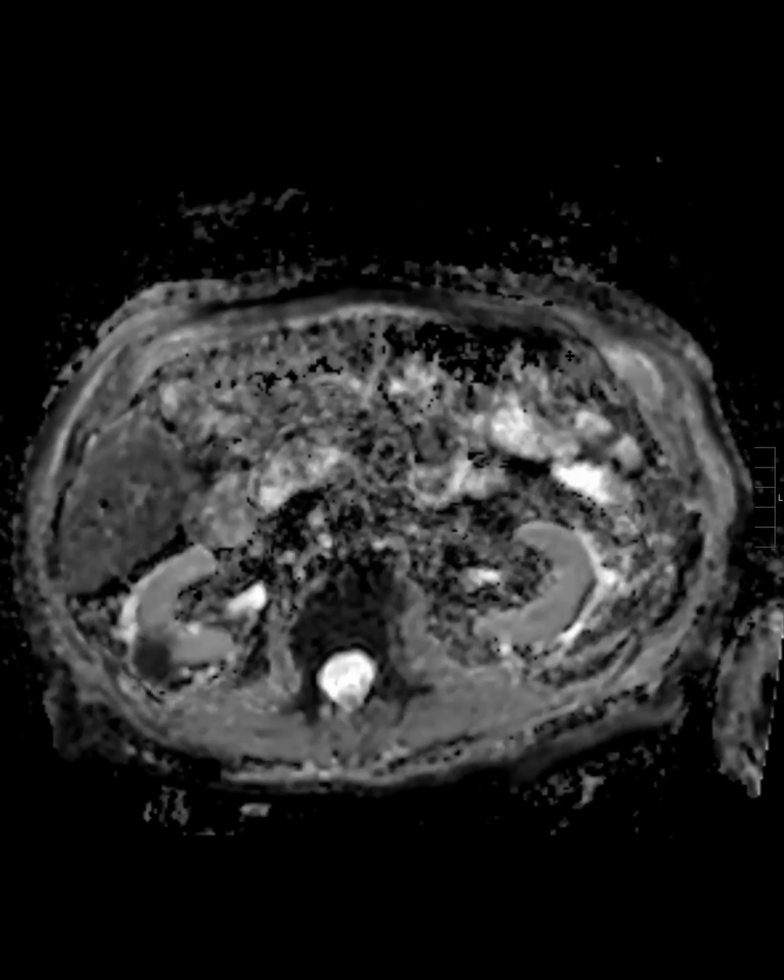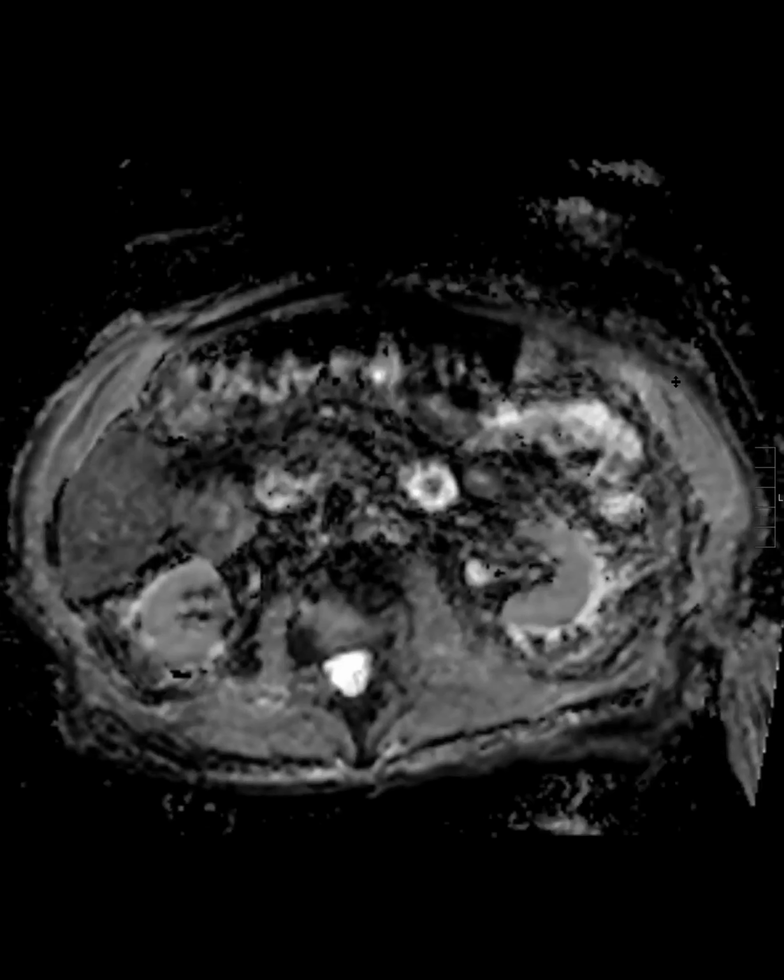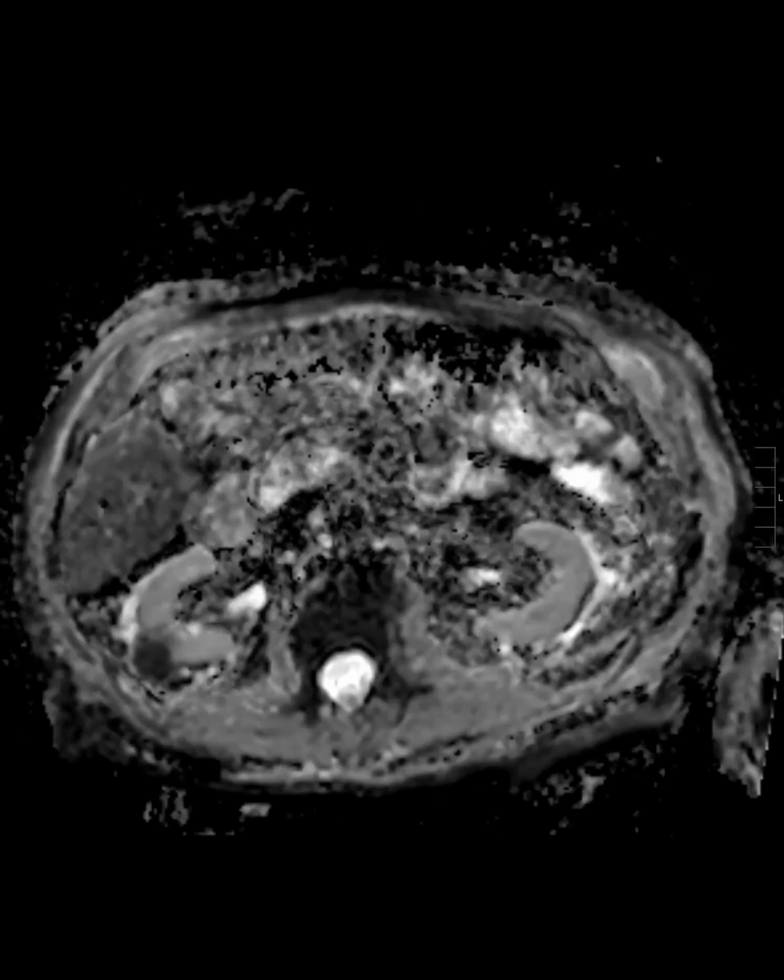I wonder where this would fall. Well, that's what I was thinking. Yeah, a few several years ago compared to over time, like when we started surveying. So yeah, that's exactly right. Roopa, I forget who said papillary, but that's definitely one of the differential, right?